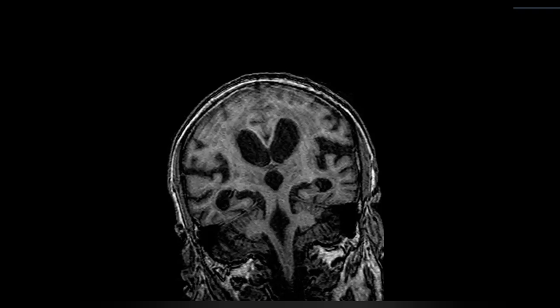So, if the patient presents with the symptoms of 3Ws, are you familiar with 3W symptoms? Yes, sir. So it's normal pressure hydrocephalus. Yes. So it's not an atrophy basically.